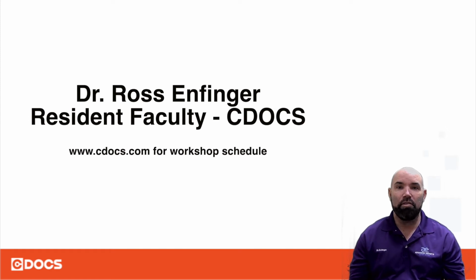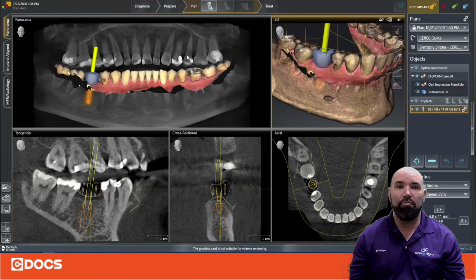My name is Ross Enfinger, and in today's video we're going to be reviewing the difference between using panorama mode and implant aligned mode when virtually planning an implant in SICAT Implant 2.0. So let's take a look at the following video.